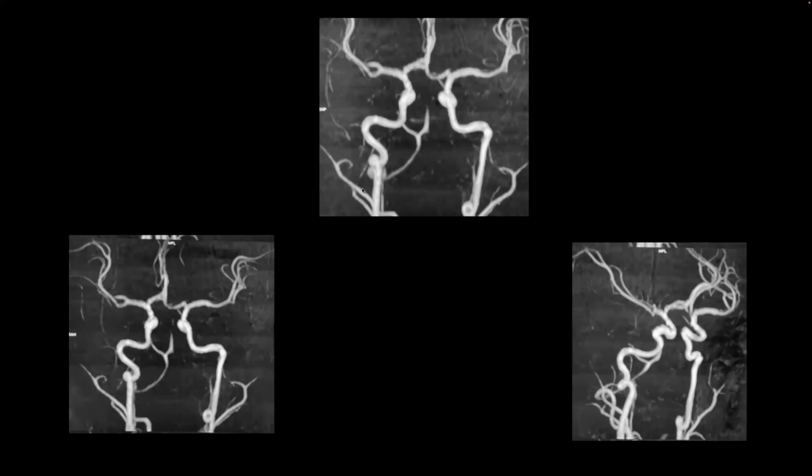Angio was done. I don't have the source images, only the MIP images, and you can appreciate that the vertebrobasilar artery system is abnormal. The left vertebral artery in particular is not visualized. The basilar artery is not clearly visualized. They're seeing the right vertebral artery. So going with ischemic changes in the posterior circulation territory with abnormalities of the vertebrobasilar artery system.